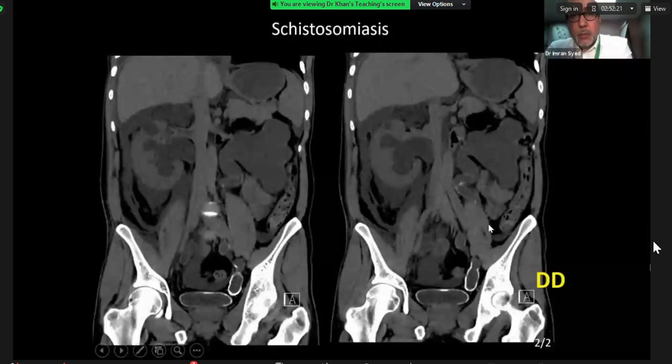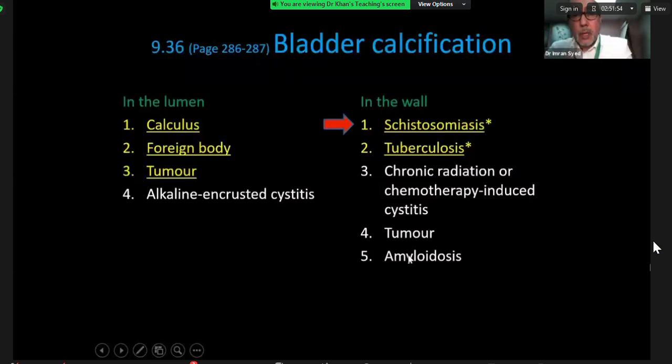This is the same patient with the coronal formats, and you can see exactly what we've described, with a lobulated outline to the left kidney, dilated and obviously not contributing any function. The right kidney, and the important thing to note, is that despite the pelvicalyceal dilatation, which is the terminology I would use, has preservation of the renal cortical parenchyma. And this is the calcification as you've described.